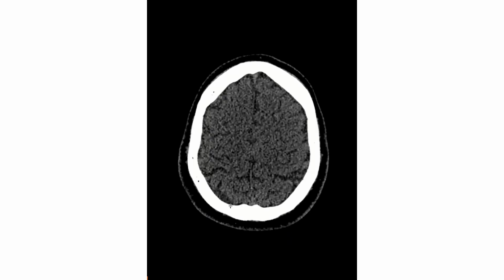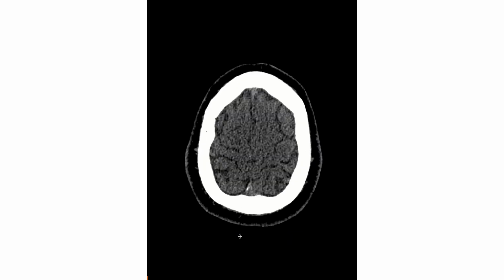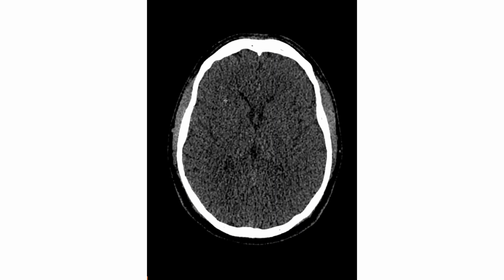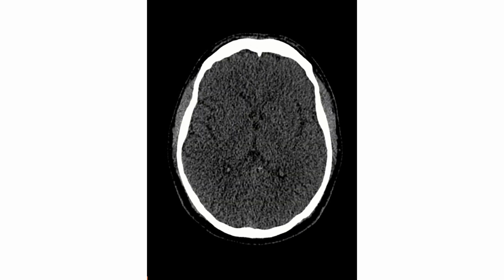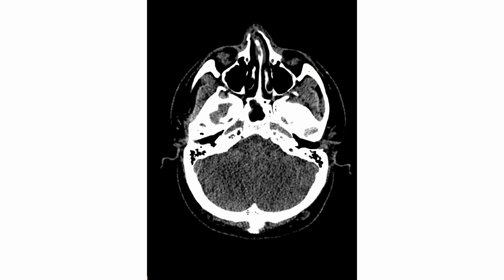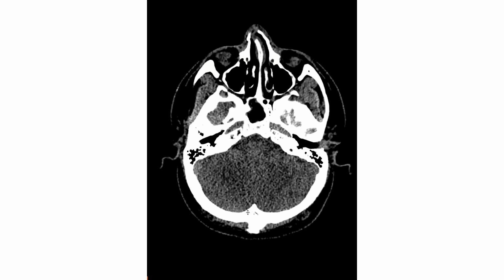And then at the end, I just want to quickly look at the whole brain parenchyma, look at the sulci, and then make sure I don't have any subarachnoid hemorrhage that I missed. I look at the appearance of the bilateral basal ganglia, look at the thalami, they are symmetric, there is no hypodensity such as evolving infarct, and then I look at my cerebellum.